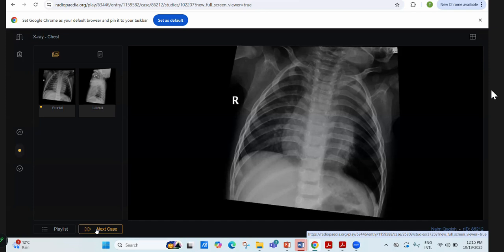However, distally, the left main bronchus is of relatively narrowed lumen. I can appreciate mild rib crowding on the left side in the left upper zone. Bilateral cardiophrenic angles and right-sided lung parenchyma grossly appear normal. There is no abnormality within the right hilum.